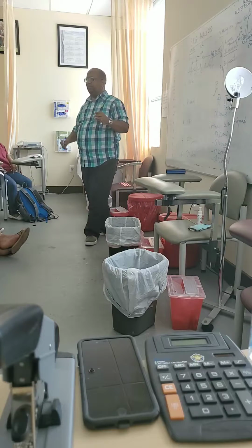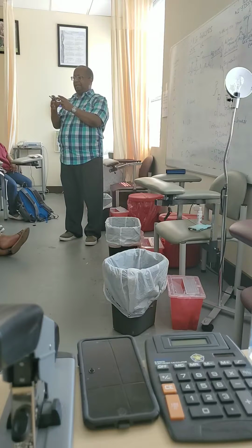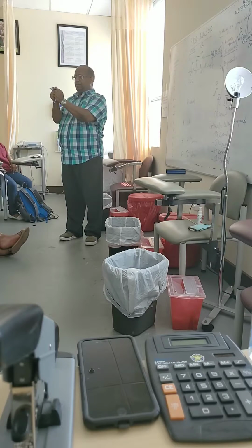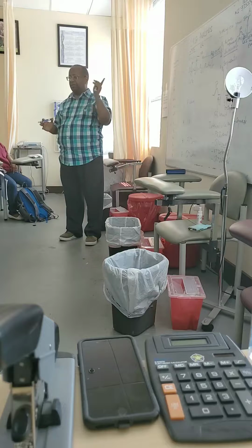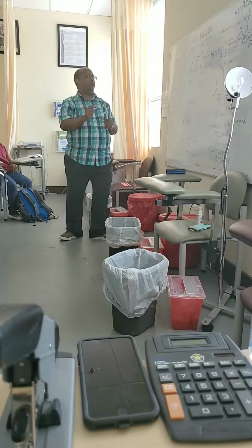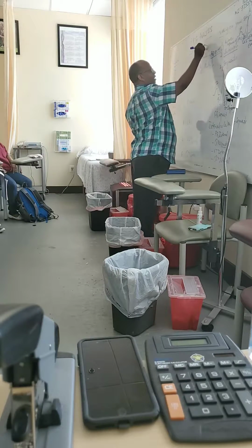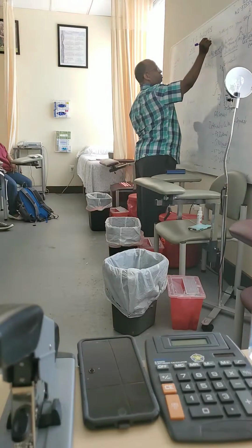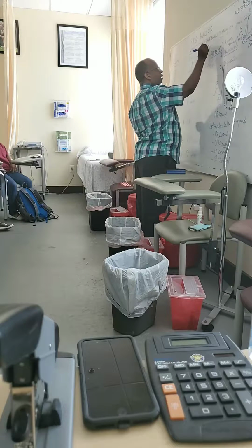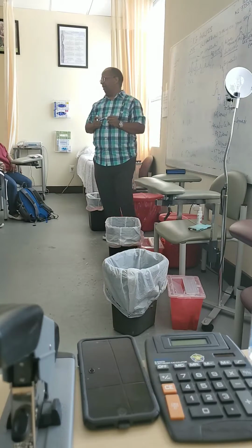What does RR show? RR shows the ventricular rhythm. It means when the ventricles get the electrical impulse, the first one gets the impulse and then the next one gets the impulse. That gap is RR. This is for the ventricles, so we call it the ventricular rhythm, and PP is the atrial rhythm. So basically we have these two rhythms, atrial and ventricular.